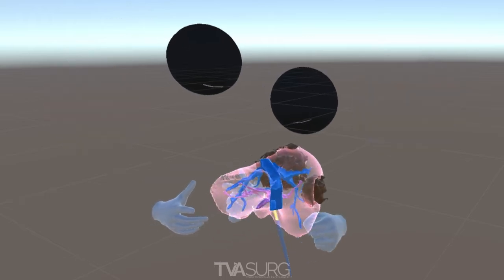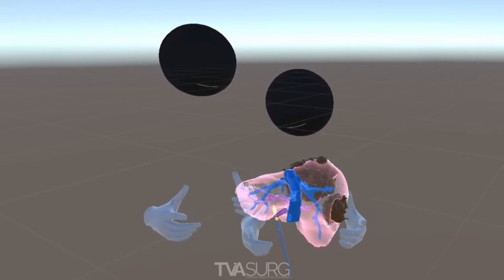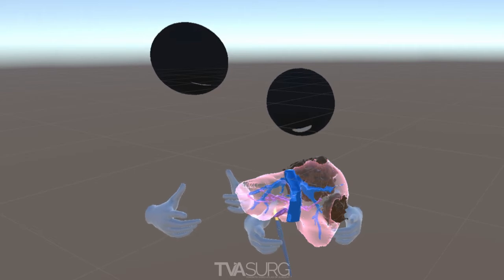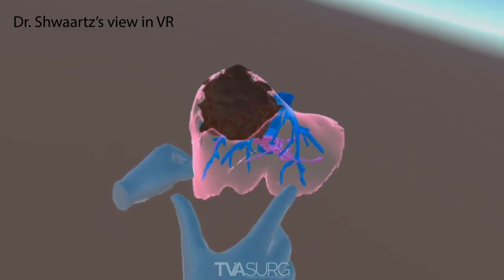See? And this is a model for a 36-year-old patient with a colorectal liver metastasis that presented with a colonic obstruction, with a colon tumor in the sigmoid, and metastatic to the liver. Before we move forward to surgery, you can see the anatomy here.